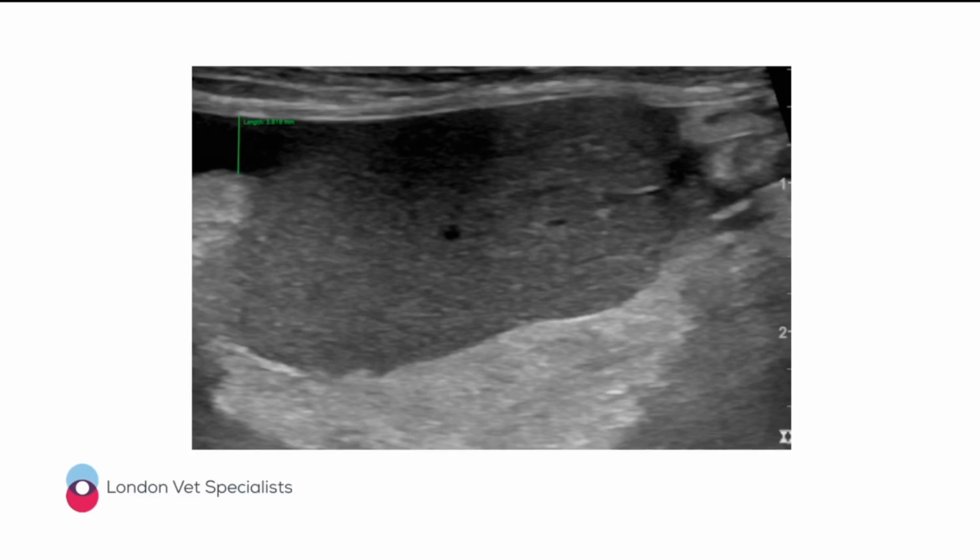And I've been asked to do that most commonly in patients that have a hemoabdomen, and the clinician is concerned that there's ongoing hemorrhage. So that's just a little tip about how you can sort of semi-objectively define an increase in volume in the peritoneal effusion in, say, patients with a hemoabdomen that are suspected of having a continuous bleed.